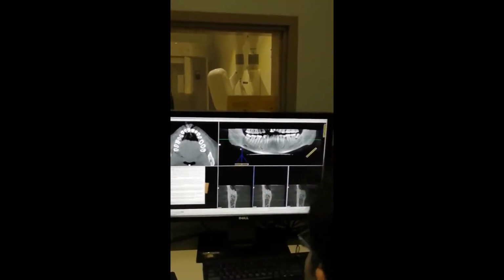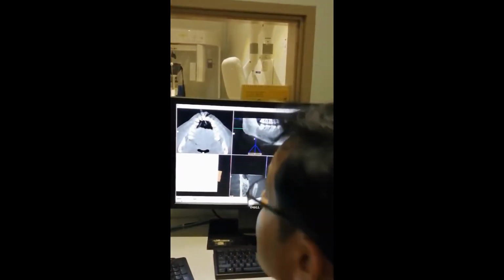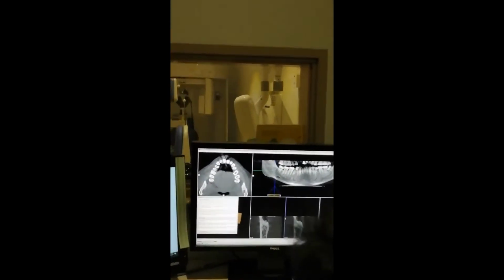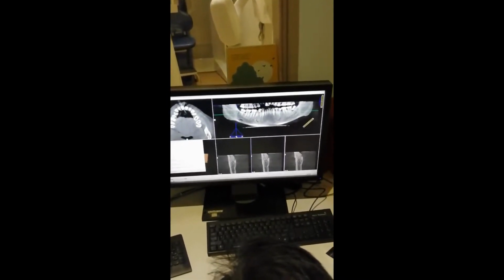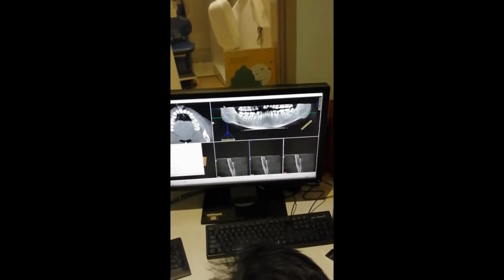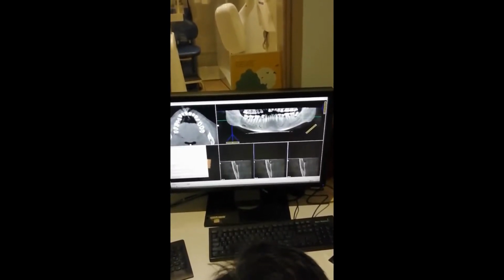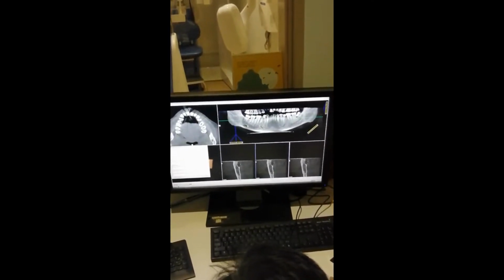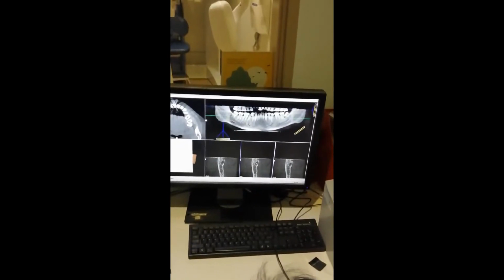Yeah, fine. Now it can be color coded so that we'll be able to see where the canal is. Fine. How to do that? We already clicked estimation of nerve canal. So I'll just keep my cursor here. This area is getting highlighted here. Correct? So I come a little bit down so that I have that confined cavity. Now I'll just right click here.